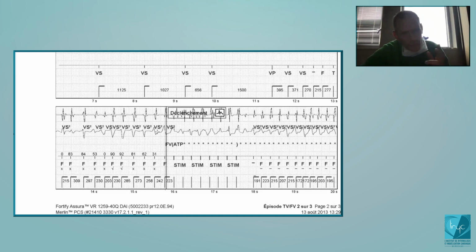That's quite a revolution for the ICD, because initially the only sensing channel was the bipolar one. And anytime you sense one signal, there's going to be one marker, VS2. So there's no different marker for VF zone, VT zone, or VS in this channel. Any cycle will be classified VS2, whether it is slow or fast.